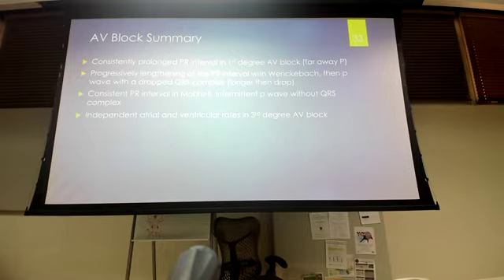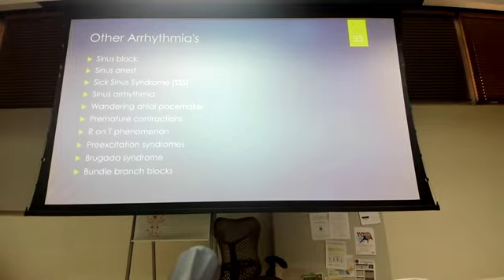Okay, but what you have in between there is a bunch of P waves because the atria is still depolarizing at 60 to 100 beats a minute. So you're going to have a whole bunch of P waves to about 4 to 5 R waves along that bottom end, or maybe 5 or 6 R waves along that bottom portion of the heart rate of 20 to 40. Now we have to talk about, whoa, wow, y'all just let me talk forever.